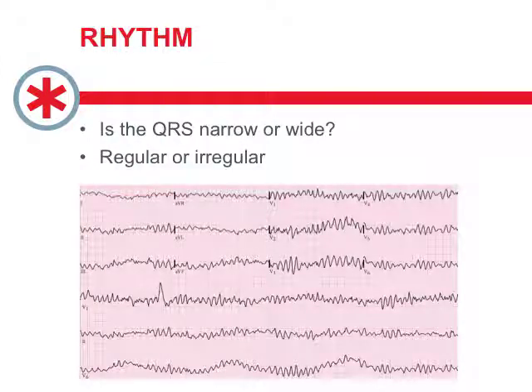I hope they did not sit too long getting this cardiogram, but apparently they did. So what is it? So this is ventricular fibrillation, right? Wide complex QRSs, basically quite irregular all over the map and unorganized. This needs a little jolt of electricity, not a better cardiogram.